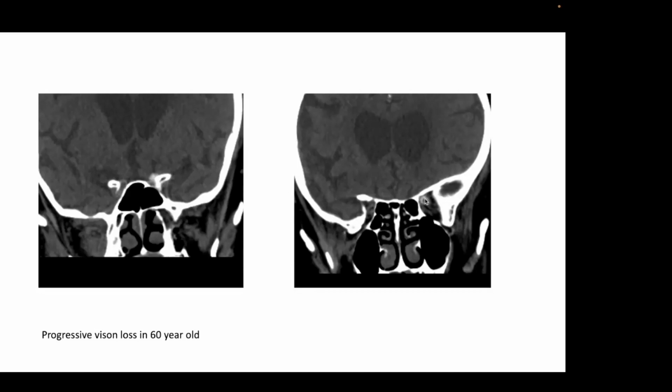So what do you think is a reasonable diagnosis in this patient with slow vision loss? Hemorrhage helps you a little bit in the sense that the symptoms should be acute, whereas this patient's symptoms actually go on for months. What do you think the disease process is here? Maybe diabetes. Diabetes, we know, gives us vascular disease, but it should frequently be symmetric.